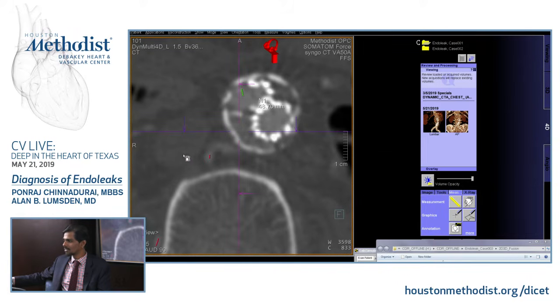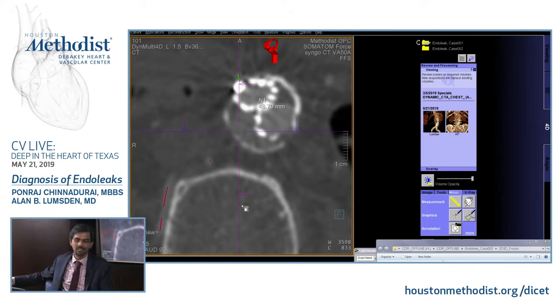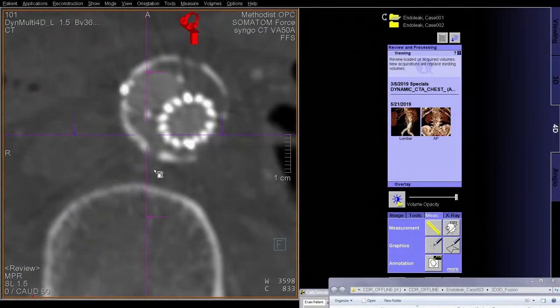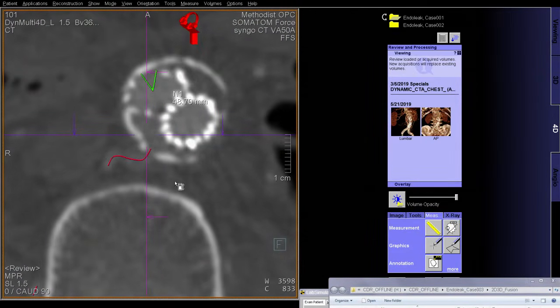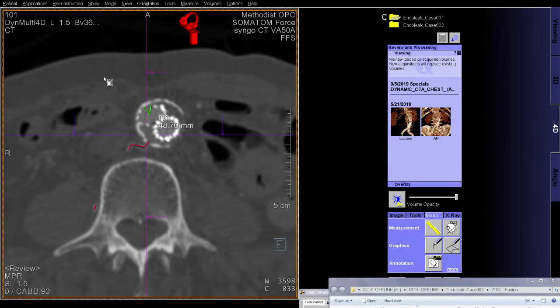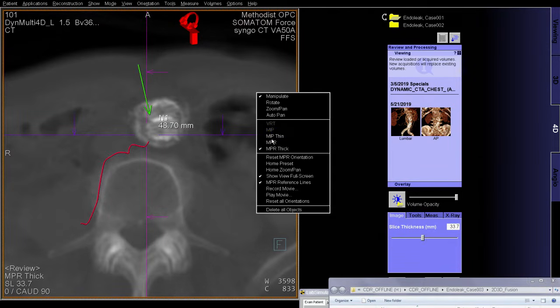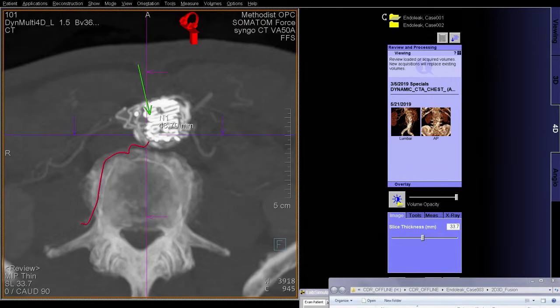Yeah, this red center line is drawn by hand because of the lumbar arteries, because they have various anatomy. Sometimes they have separate origins. They might have single origins. So here it looks more like a single origin. We see faintly the left side lumbar arteries. And what other thing I have marked here is, if I make my slice thicker, you'll see the needle path. That is the virtual needle path that we have planned.